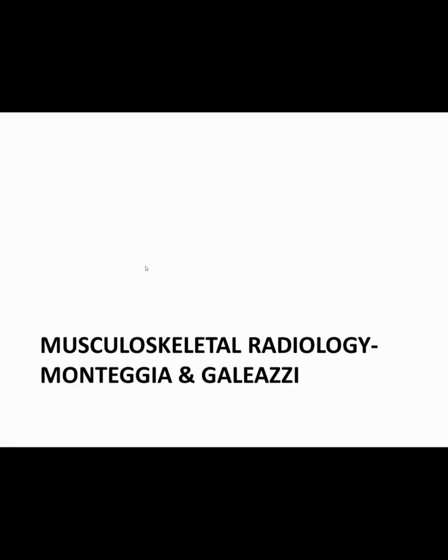This is a case of Monteggia and Galeazzi fractures. In this instructional video, I will go through the vignette provided for you in the case module, show you an approach to elbow radiograph interpretation. We will apply it to the images provided for you, and then we'll go through the post-module questions together.